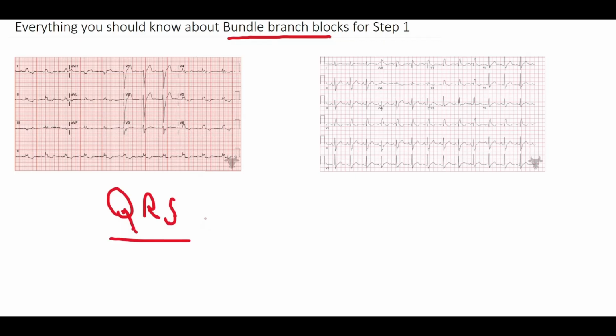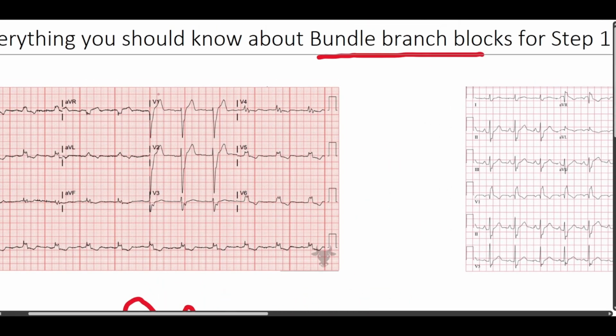It is wide, right? So it's going to be bigger than 3 small boxes. Okay, 3 small. I'm just going to put small. Okay, bigger than 3 small boxes. So let's take a look at this example right here.